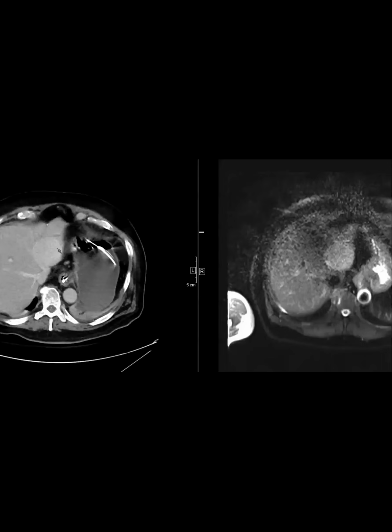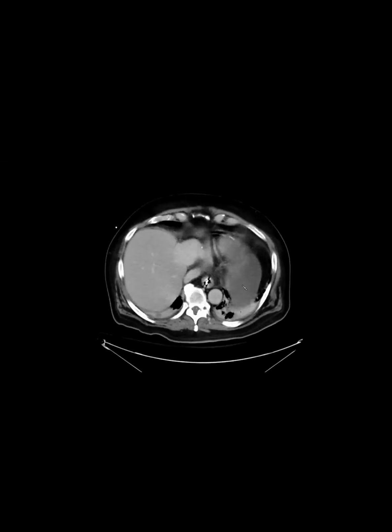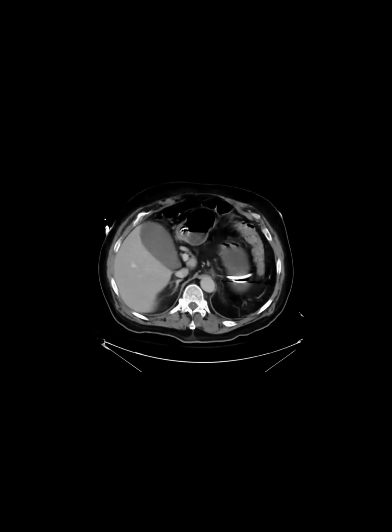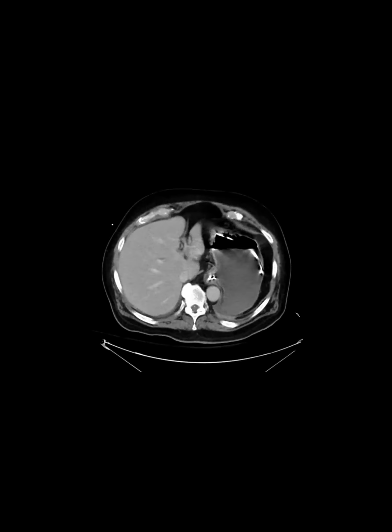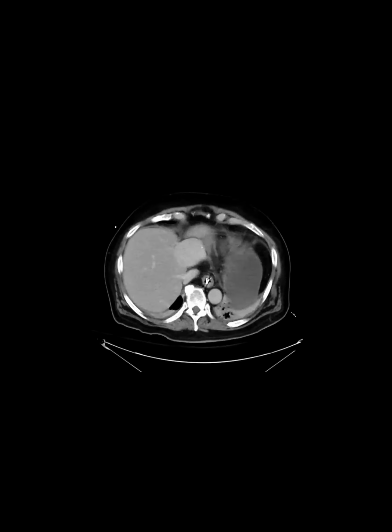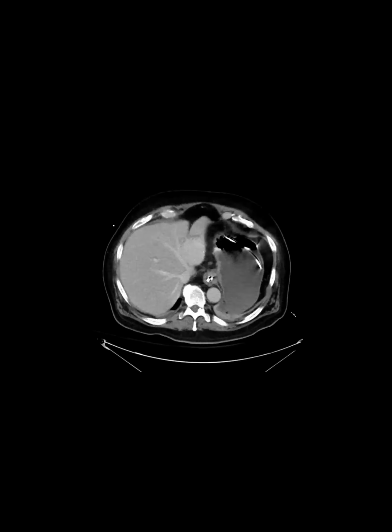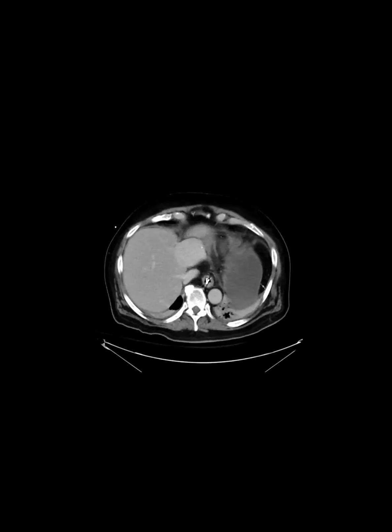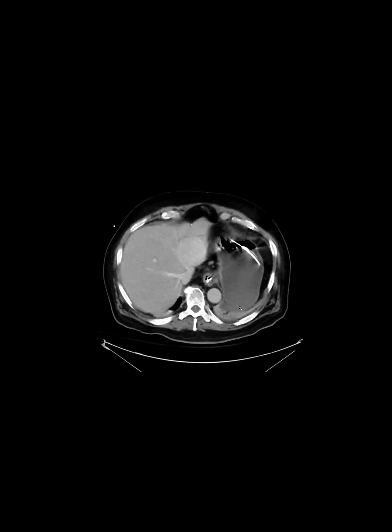I'll show you the CT again. Maybe it'll be easier there. Stomach wall is a little thick. Afterwards, you guys are going to be like, oh, yeah. There's something in the stomach wall, right? Like this. Wait, where? Splenic tissue, right? Yeah. So the spleen is missing.